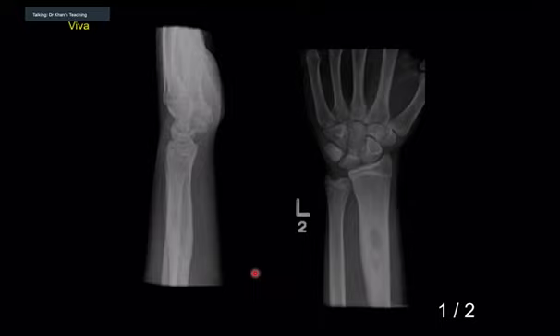So what is your differential there? So it has a narrow zone of transition. It looks aggressive overall. Has it got a narrow zone of transition? I feel it doesn't have a narrow zone of transition. Doesn't have. Okay, good. So overall, it has an aggressive appearance. So my differential would include malignancy, Langerhans cell histiocytosis. Metastasis will be very uncommon in this age group.